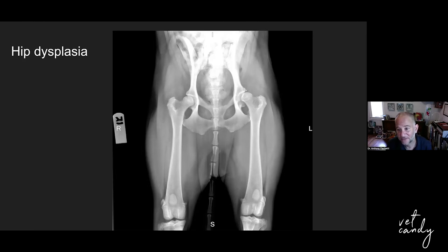And there's less than 50% coverage of the acetabular cup over the femoral head. For sure. Yeah, this hip is even subluxated, okay? I would say that this hip is not normal, although the degree of osteoarthritic changes is certainly not as notable on the left.